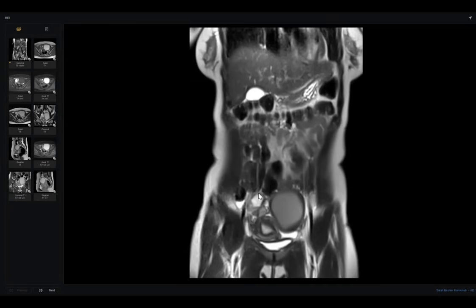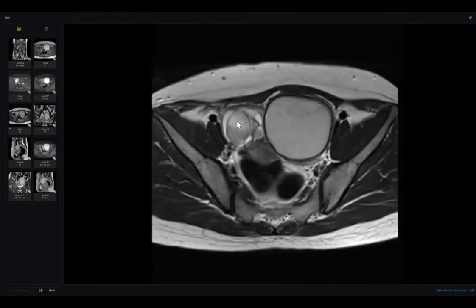Sir, can I see contrast before I give the final diagnosis? Is this lesion clear? Look here. Yes, there is a material or fluid level. Endometrioma. And why? There is a fluid level with hypointensity at the base and hyperintensity on the top. So this is most likely endometrioma. What is the name of this sign?